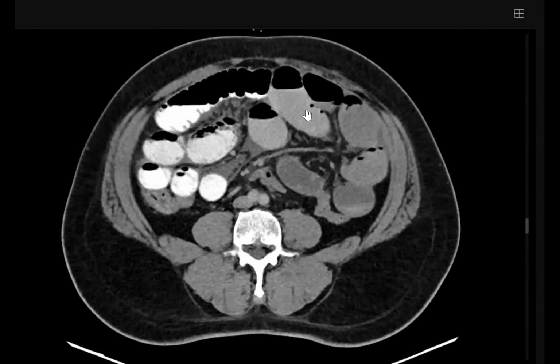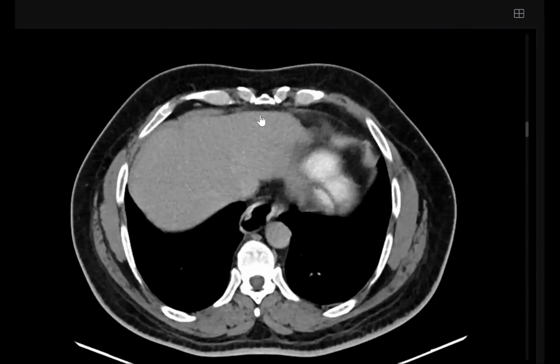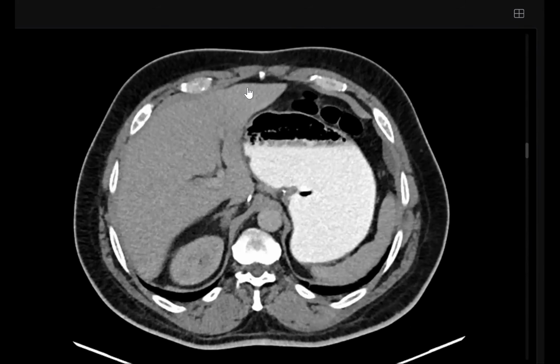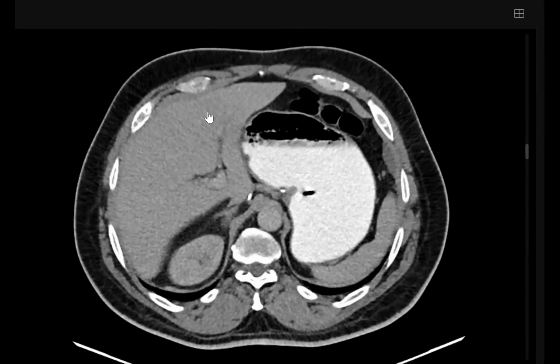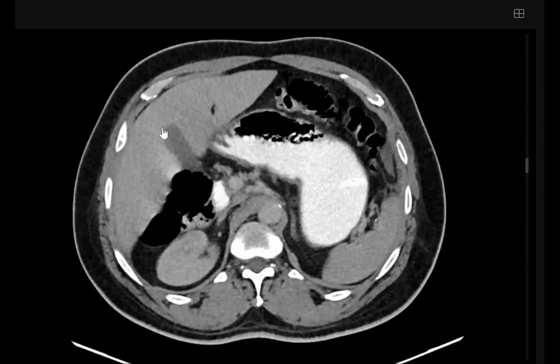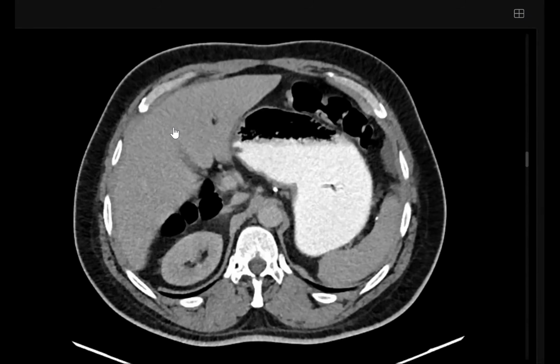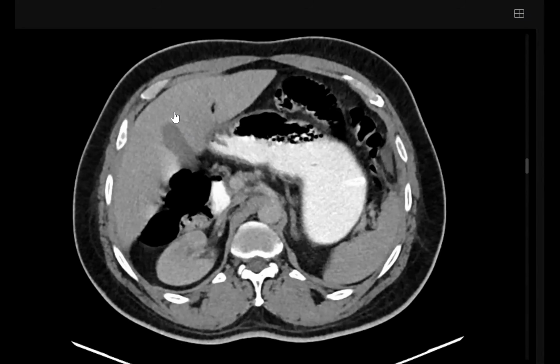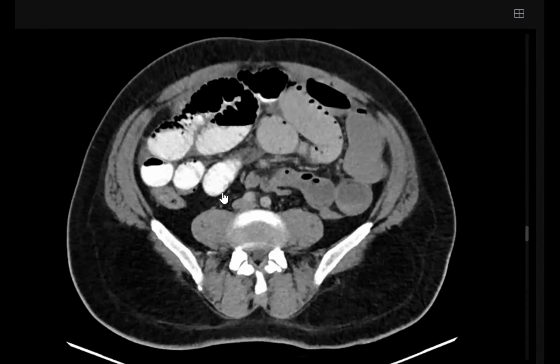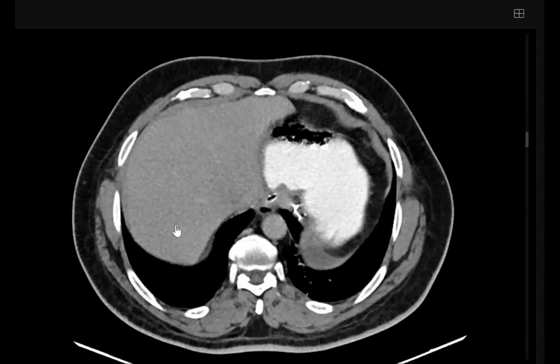So in this case, my friends, as usual, we have some bowel dilatation. But again, my friend, from the start, you noticed bowel dilatation, and looked for any information about the liver. No branching lucencies, no portal venous gas, no pneumobilia, normal gallbladder. Don't forget these points because gallstone ileus is a very common exam case, and you need to rule out this possibility on the first few cuts. Normal enhancement of the wall, no thickening. And in this case, as our friend said, no focal hepatic lesions could be seen.